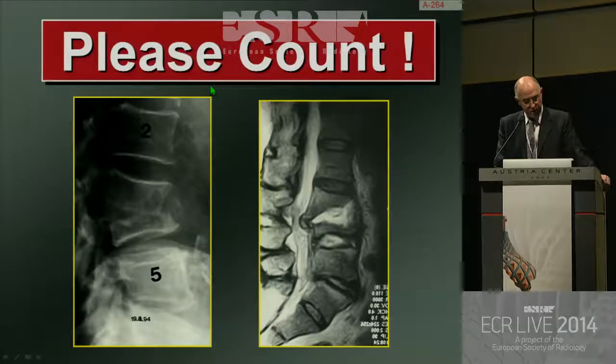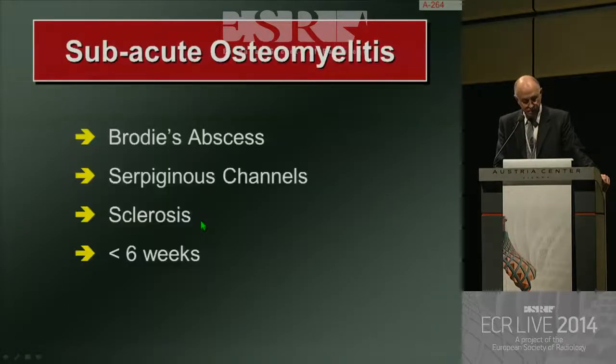So to counteract and avoid this problem is very simple. Never count the vertebral bodies anteriorly. Always count them by having the equivalent posterior arch, and therefore you will know that, in fact, you're dealing with two vertebral bodies rather than one which has collapsed.